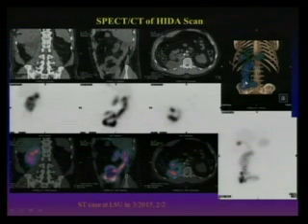When you're on the SPECT CT image, you play them, and then you follow that. You use the cursor, go here, and then you exactly trace the loops of bowel. So that's no bile leak. Very powerful thing, because people cannot get contrast, and then they do see liver injury during surgery. They have some suspicion, and then you do a HIDA study, very easy, and then you tell them no bile leak.